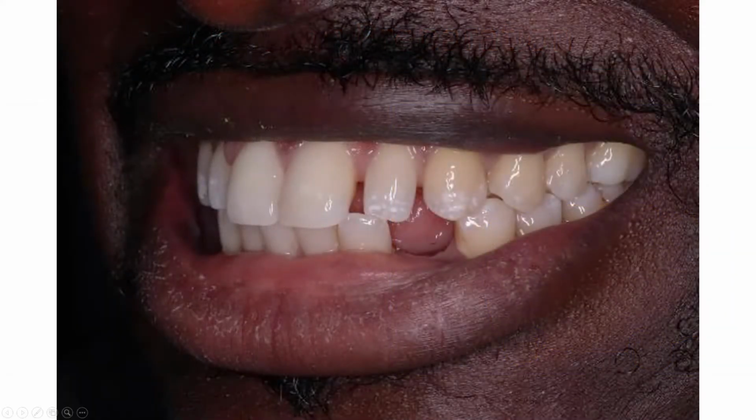Our patient was a young, fit, healthy African gentleman, and he had quite proclined teeth and spacing in his upper and lower arches. He was quite prognathic. The lower incisors were particularly proclined, and as we look at the software and the planning and the scans, you will see how this proclination of the lower incisors affects the three-dimensional imaging, and the reading of the three-dimensional imaging.